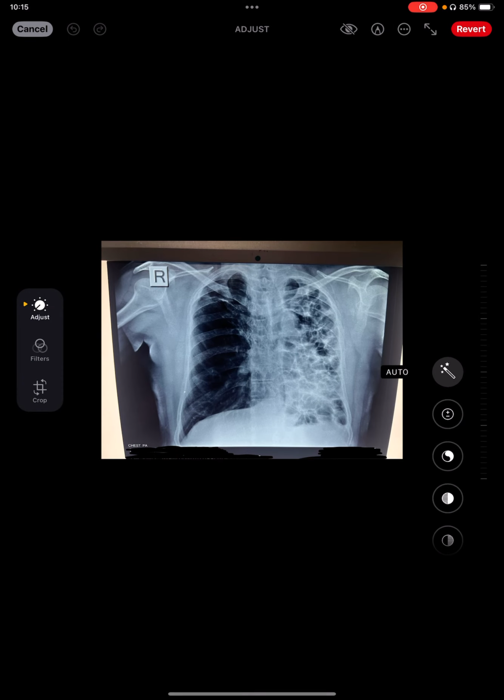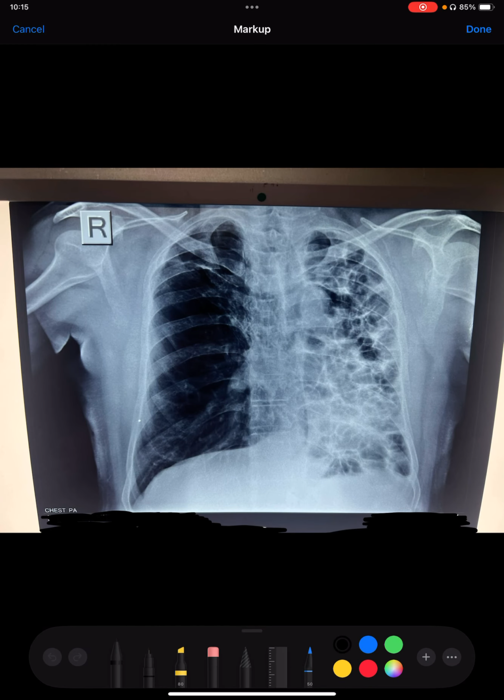Now, this is a very interesting X-ray that we'll be discussing today. If you can simply think of what this X-ray has in its findings, then we can have a discussion, or we can have something which is very, very interesting in this chest X-ray. Now, this is a chest X-ray that is in PA view, as we can see here.